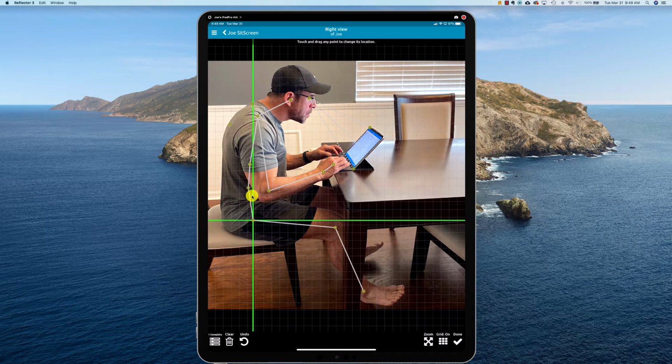Okay, and of course you can move any points that you see to. Now remember, this is going to be the mid-torso, so it's underneath my arm. Okay, just so you know. All right, and if you ever forget, you can always double check by clicking those points to know exactly where we are. Okay, you can always double check that.